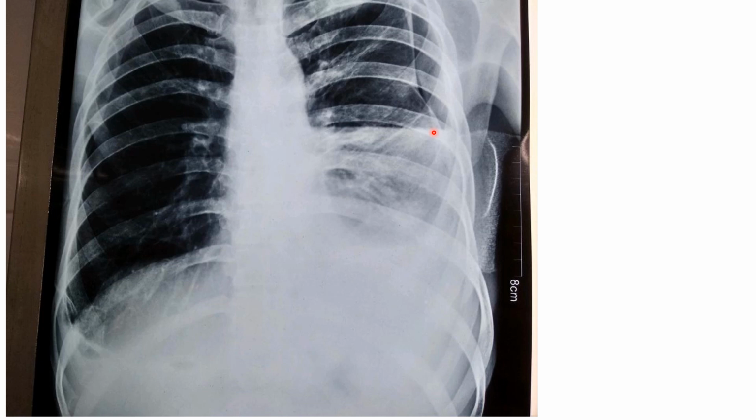So once you see more and more X-rays, you tend to identify these perfect straight lines. It's very interesting because hydropneumothorax as such is very interesting to find. And on examination, you used to get something called straight line dullness in hydropneumothorax, and this is because of this sort of air fluid interface.